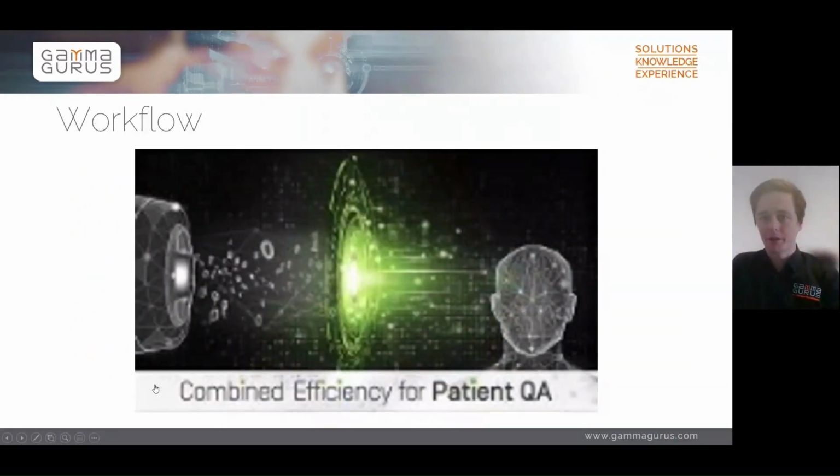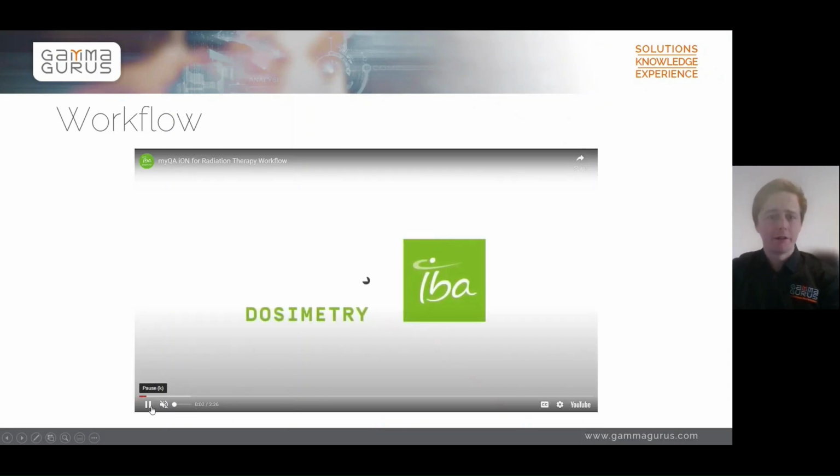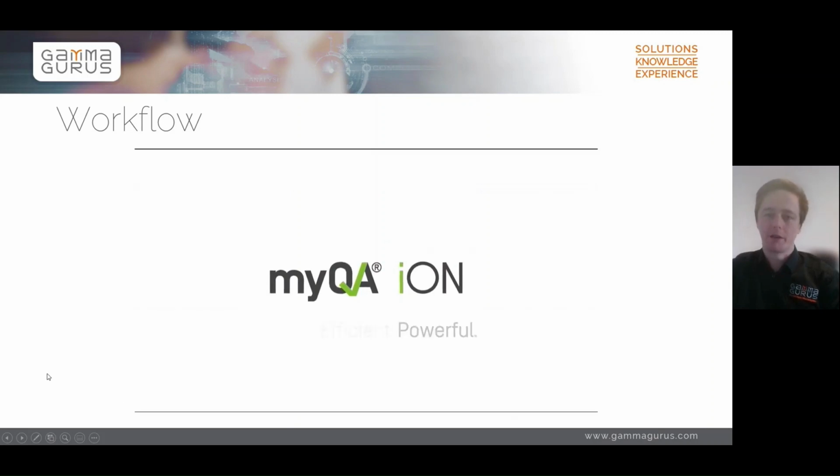So now I'm going to play a quick video showing the workflow of myQA. myQA iON is a web-based patient QA system for pre-treatment and during treatment QA. The software can be accessed from any computer within your facility.